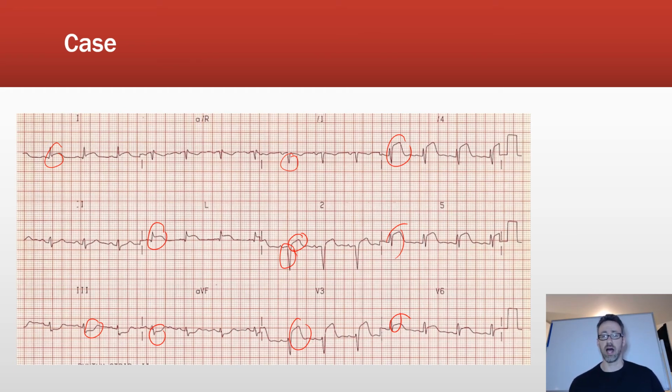But we have an anterolateral infarct for sure, and the coronary distribution could be both the LAD and the circumflex. The circumflex being the coronary that distributes to the left lateral ventricle. Being that it's both, it could be possible that simultaneously they're being occluded, which is fairly rare, but it could also mean that this is the left main coronary, which is more proximal, before the bifurcation, before it becomes the circumflex or the LAD.